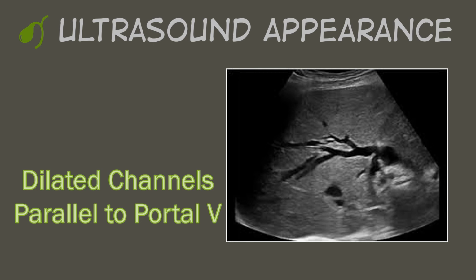The picture that we have here is showing very, very dilated ducts. These are very obvious. They usually are a little bit more subtle than this. Use your color to pick out where the hepatic veins are, where the arteries are, where the portal vein is. And if you still have this anechoic parallel channel running through there, then it is safe to call it a dilated intrahepatic duct.